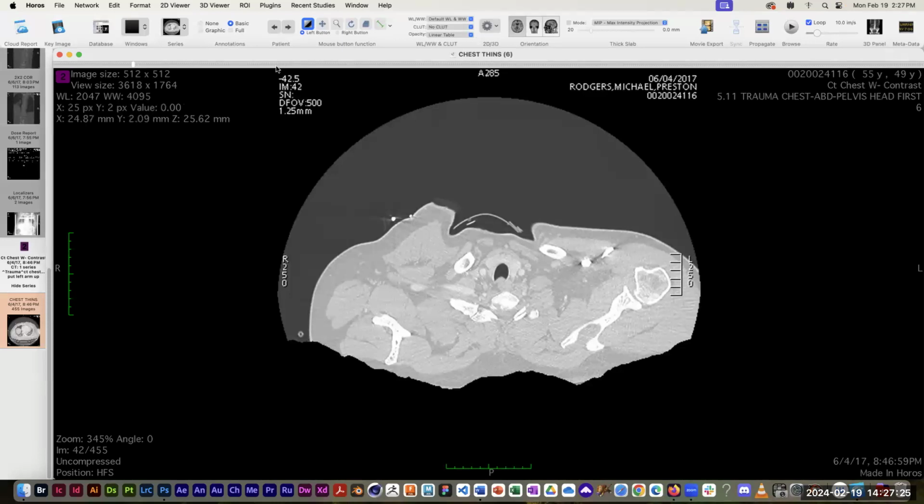Remember we looked at this number up here in the upper left? That negative sign matters. So you think, okay, spacing is just a distance, right? Why would you put spacing in as a negative distance? But apparently that actually matters. So when I said that the spacing was varying between 0.62 and 0.63 millimeters, which you split the difference, it's 0.625 millimeters. It's actually negative 0.625.